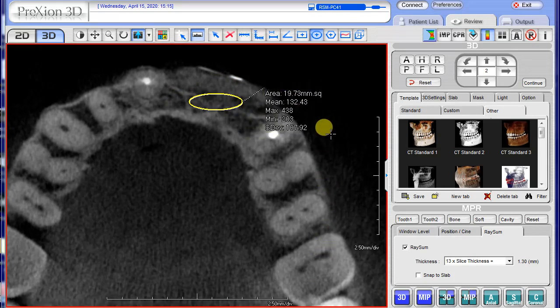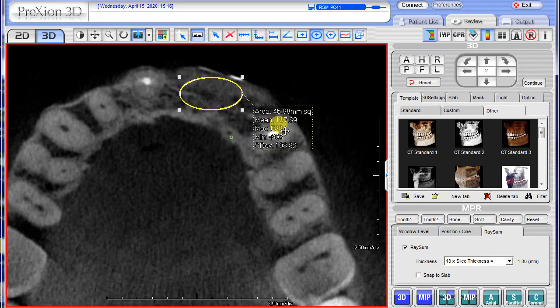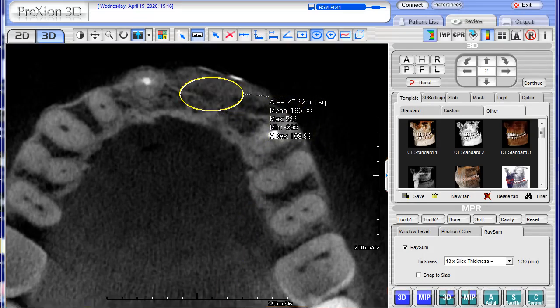To alter these shapes, click on the measurement, and the white boxes, you can drag the white boxes, and when you release it, there is your new measurement. If you need to do that again, click another white box, drag it, release, and that's your new measurement. Remember, right click and delete.